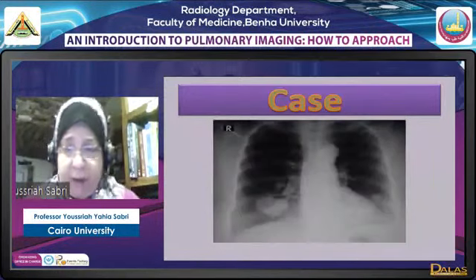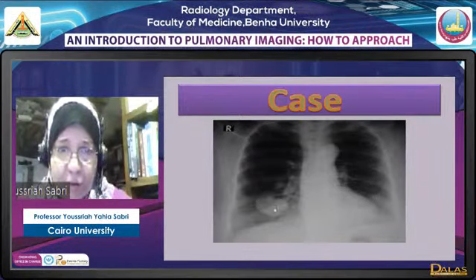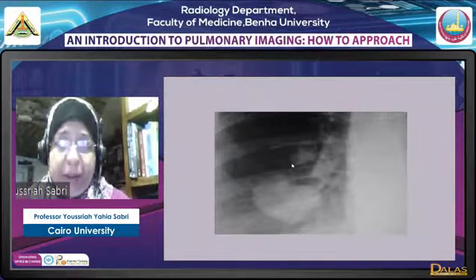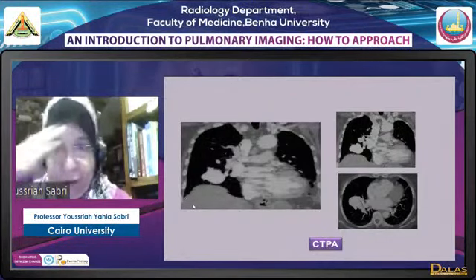There is another case here as well. This was an elderly female coming with hemoptysis, chest X-ray showing a lobulated large mass with a prominent interlobar artery related to it, and another lesion. Again, AVM considered. CT was done, and the CT pulmonary angio is relatively old, more than 15 years old.